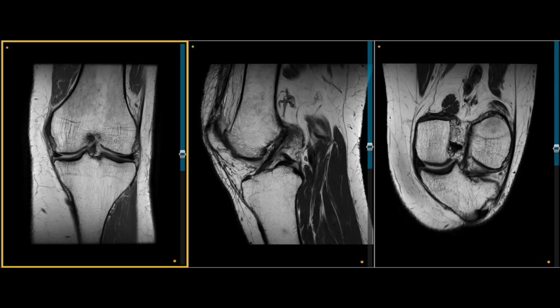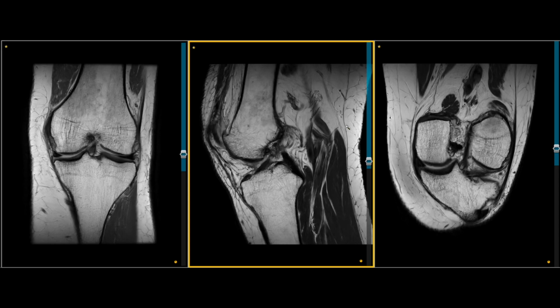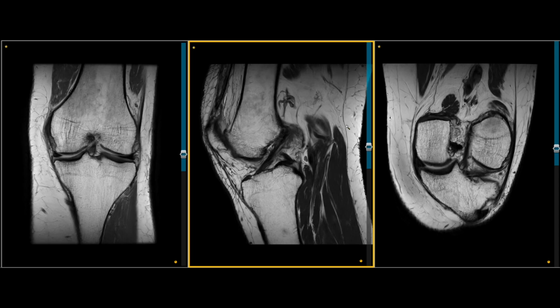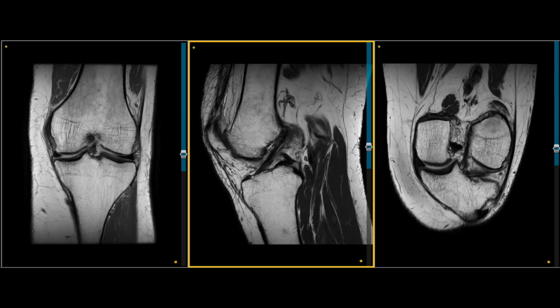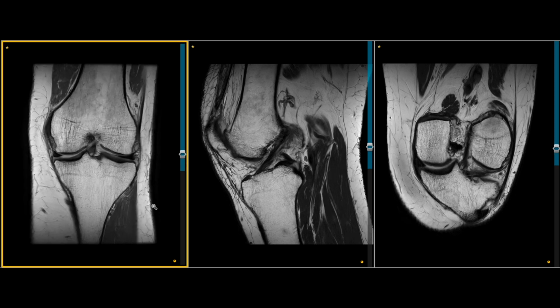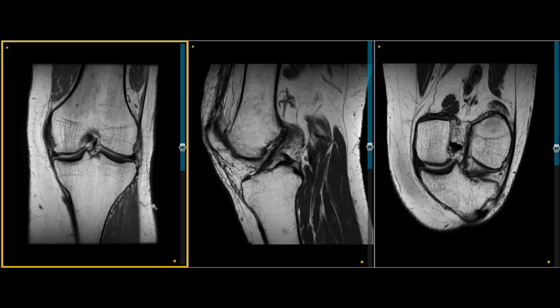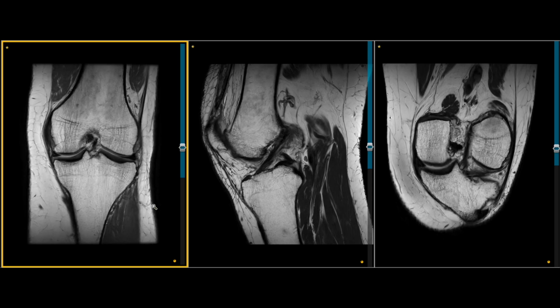So here is an MRI at 12 months post CBP, which shows the healing outcome as reduced thickness of the ACL. However, the ACL remains taut, so we'd call this the reduced thickness taut ACL. If we look at the coronal sequences as a start point, we can check that the ACL is contiguous from its tibial through to its femoral footprint.